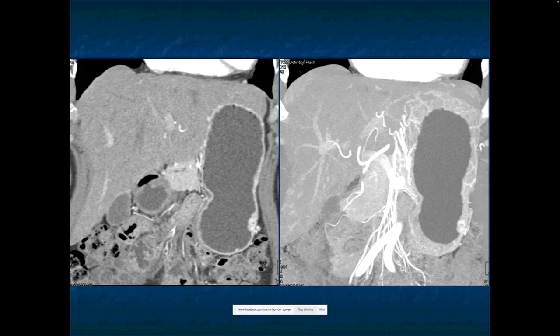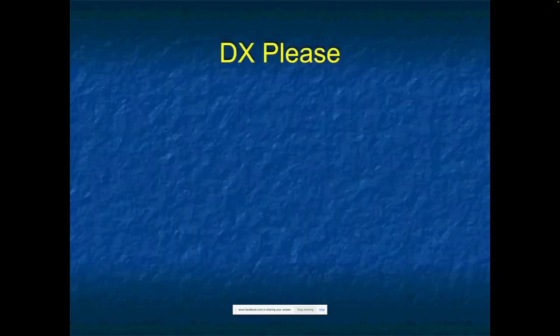You can see other things in the stomach like pancreatic rest, but they're typically more hypovascular and typically occur in the antrum of the stomach, not in the body. You also notice there's one lesion, not multiple lesions. If you had multiple lesions, you might think about a polyposis syndrome, or you might think about a patient with MEN1 who has multiple neuroendocrine tumors in the stomach.